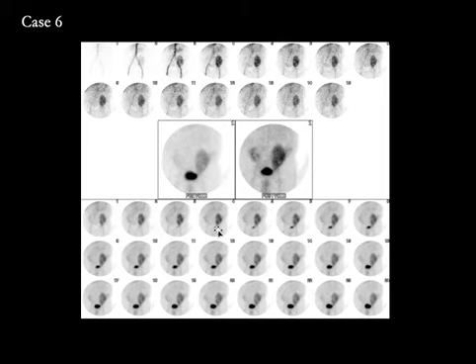As we go through the images, we find that the kidney produces radioactive urine which accumulates in the urinary bladder. But at the end of the study, we find that there is significant amount of activity in the soft tissues, there is significant activity in the transplanted kidney, and there is some production of radioactive urine. The post-void spot view is shown here with similar findings, but there is another reniform focus in the right hemipelvis. This is a previously transplanted and failed kidney in the right hemipelvis.